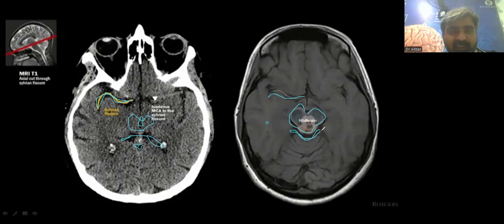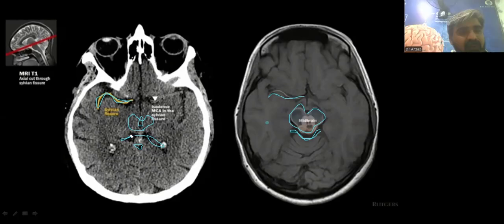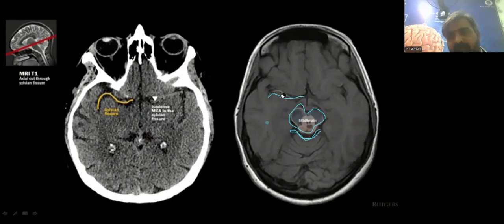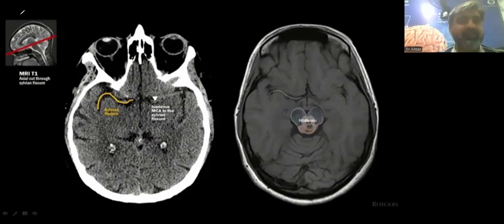There are 4 cisterns. Anyone can name it, please? Yes, sir. Quadrigeminal cistern, sir. Okay. Ambient cistern. Okay. Interpeduncular cistern. Hmm. And quadrigeminal. Perimesencephalic cistern, sir. Okay.